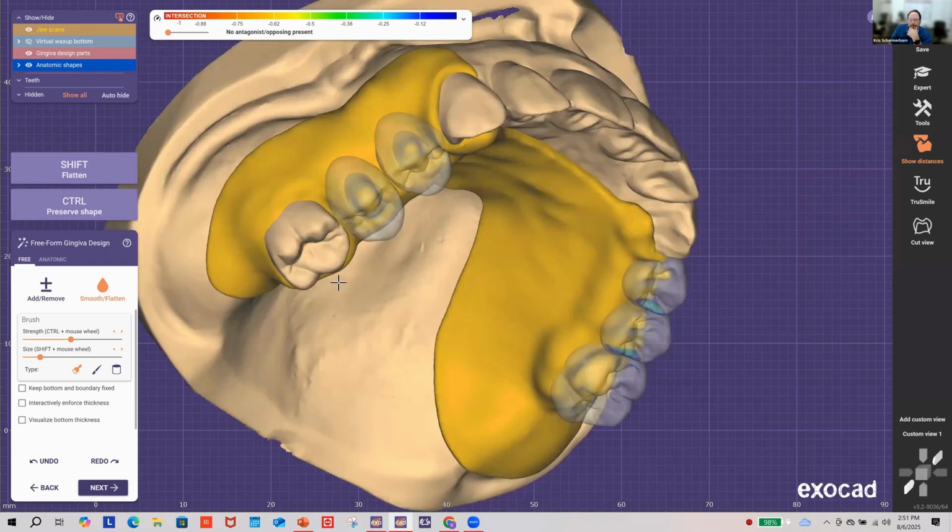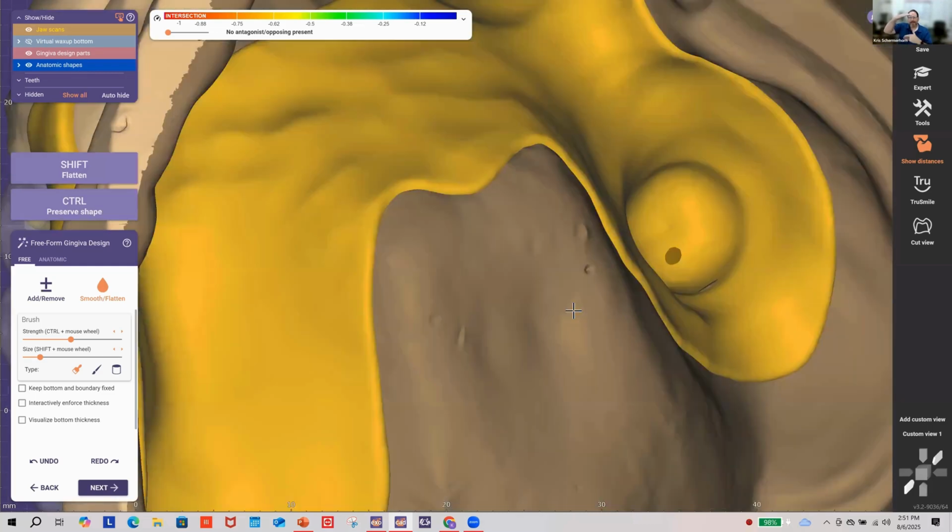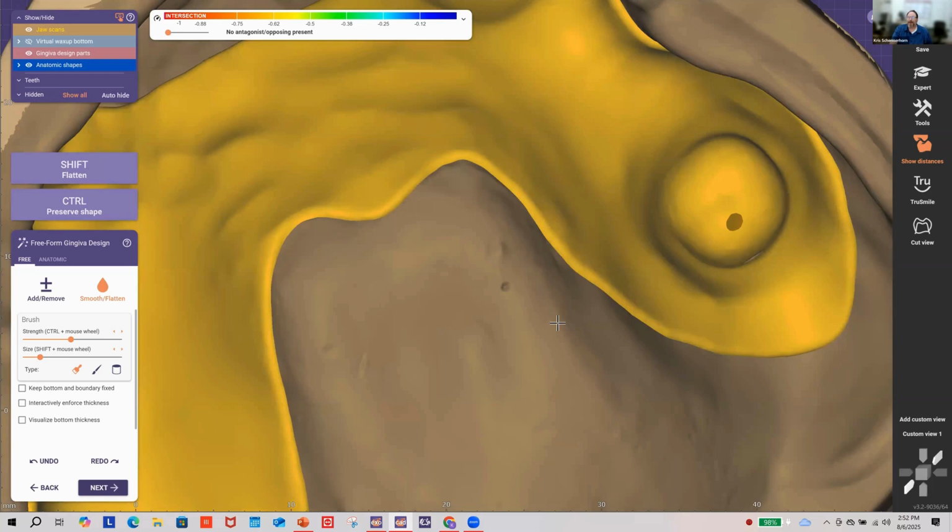All right. So do you see this right here? All digital scan files have an outside and an inside, right? What we're going to eventually make is a solid, but for digital files, you have an outside skin and an inside skin. And what I've done is I've pushed the top skin through the bottom skin. This is something that will possibly keep you from adapting and give you an error, and you won't know why. You'll try to adapt the teeth to the base and it'll say error, and you'll do it again, and you'll be scratching your head and frustrated.